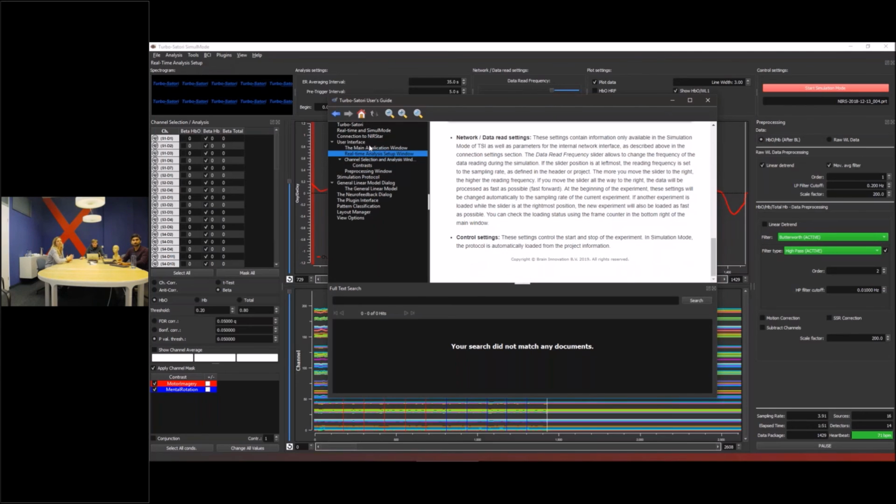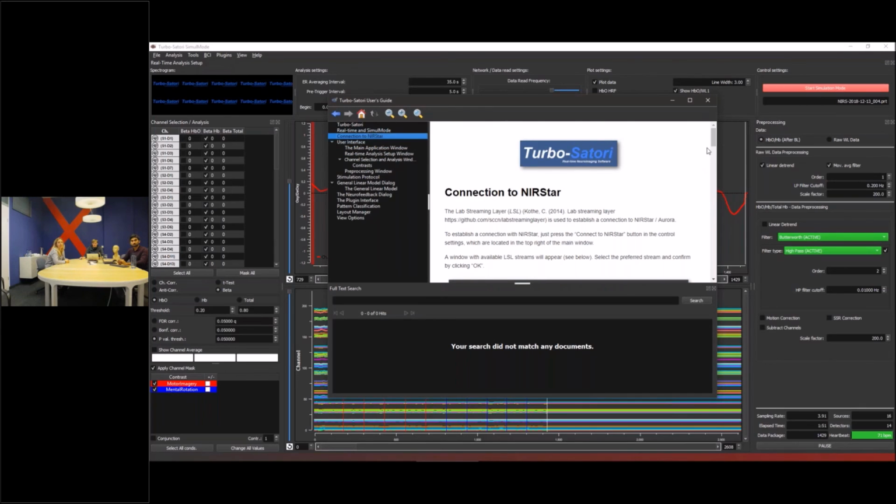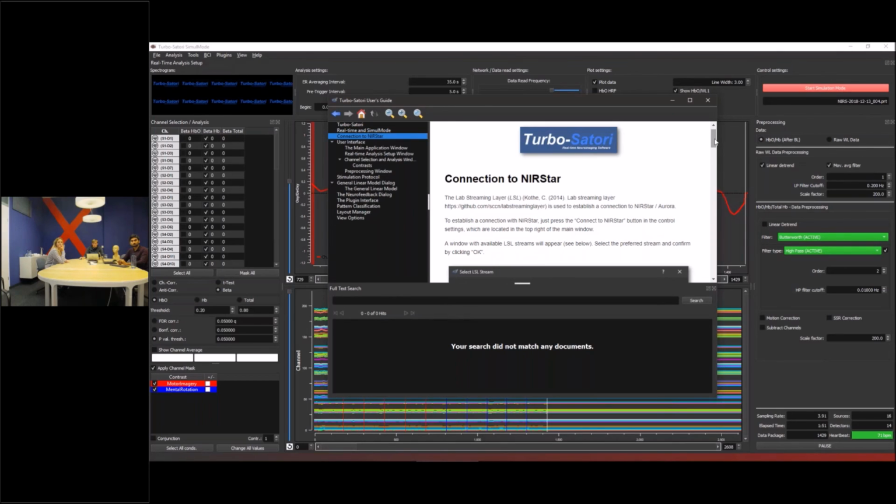No, but the method itself is based on the frequency of the data. It does a frequency analysis of the channel, and in the channel where it finds a specific heartbeat frequency, which lies in the range of 0.7 to 2 hertz, if I'm not mistaken, then it will show the heartbeat symbol. Meaning that if there's any peak or any high difference compared to the filtered series before it, then it will be used as a heartbeat.